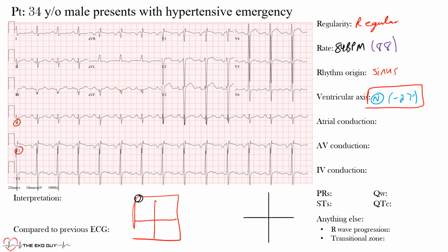The sinus starts from the right side and then moves to the left side, meaning that the right atrium depolarizes before the left atrium. Why is that important? Well, that's how it shows up on the EKG. The beginning portion of the P wave represents right atrial depolarization, where the latter portion is left atrial depolarization. And that's easiest to see in lead V1.